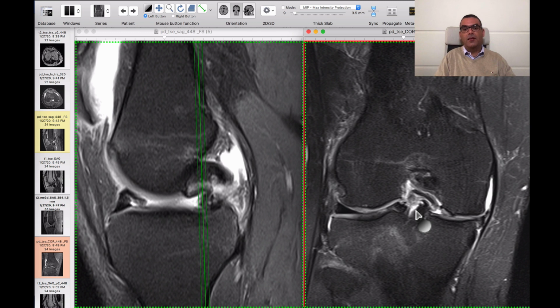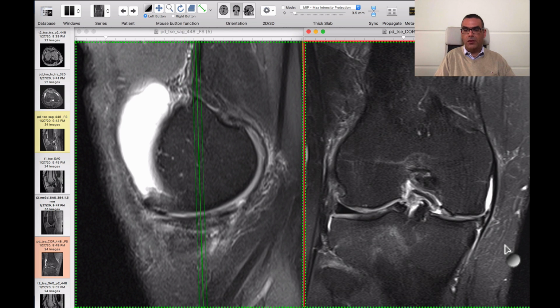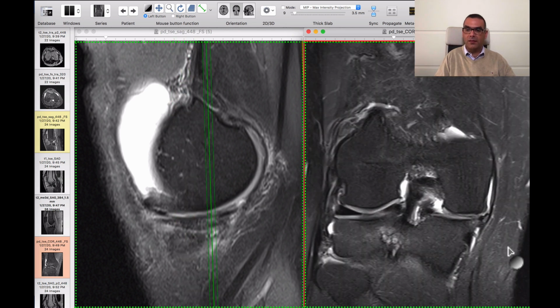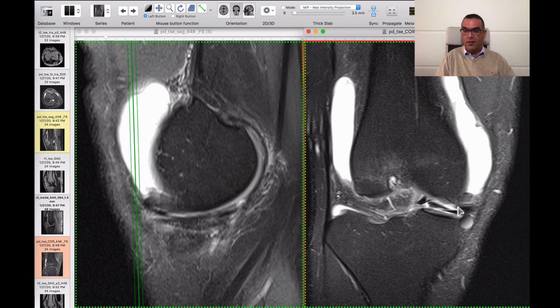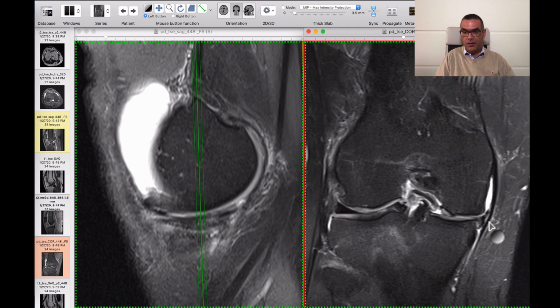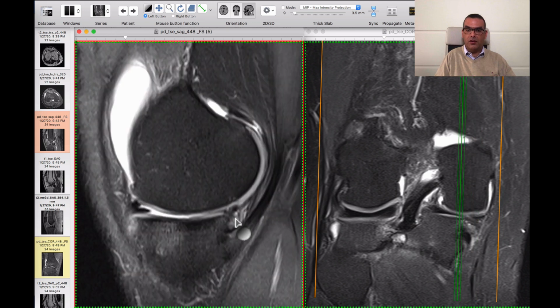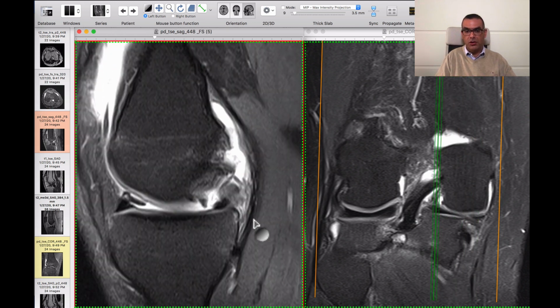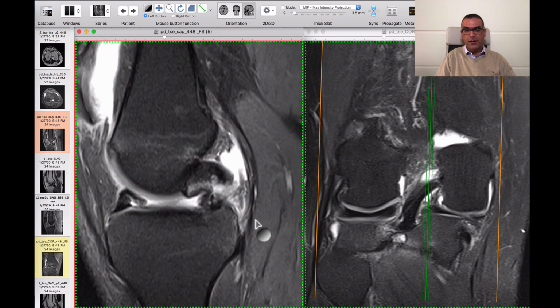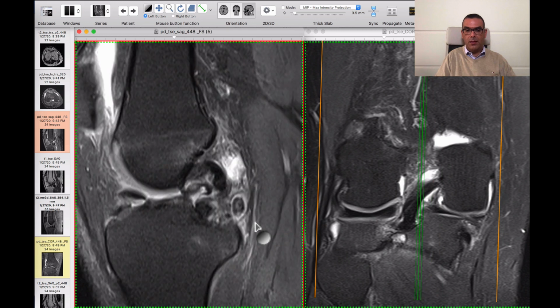This is the type of tear that is difficult to diagnose, that is difficult to describe, but you have to go step by step. First, you note that there is an abnormal girth of the meniscus. When you see abnormal girth of the meniscus, you have to suspect flap tears. There are missing parts. There is clearly a missing part from the anterior horn. Most of the meniscal body is amputated. Of course, this posterior horn is also small and irregular in shape, but this is correlated with the previous operation. And we can see now how the meniscal horizontal flap tear may appear.